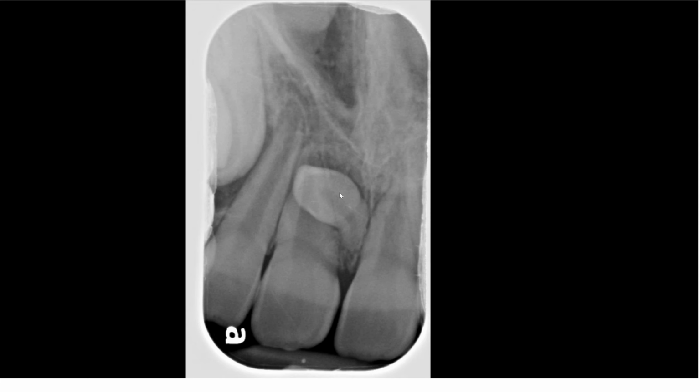And we can actually see the pulpal chamber or the pulpal canal. And even the enamel layer is very visible on this radiograph, whereas before it was really difficult to determine whether there was any enamel component or not. So I want you to appreciate the amount of detail that you can get from periapical radiograph. This detail is sometimes what helps you to come up with a final diagnosis on a radiograph.